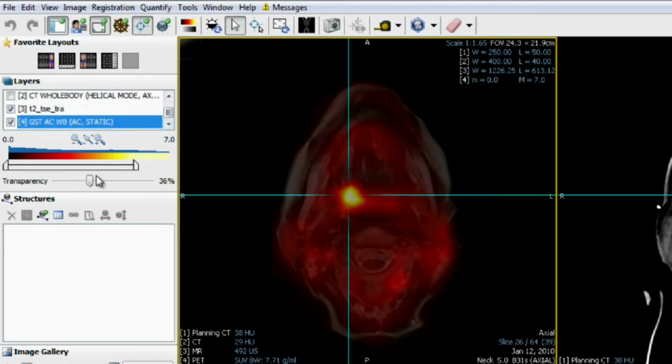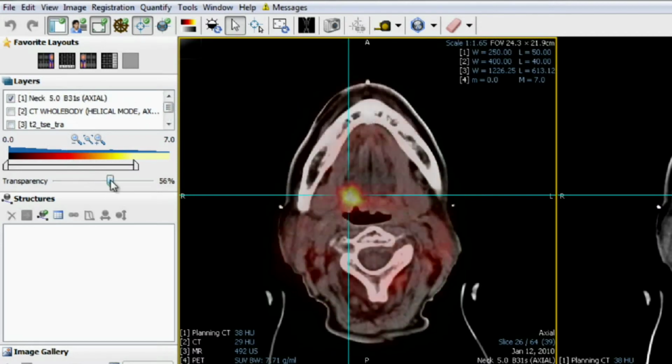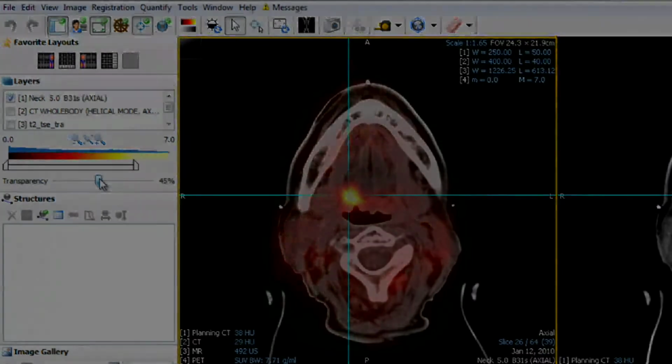Note as well that a layout can be configured to display all the datasets fused together, and that each can be disabled independently to present the fusion of the desired 2 or 3 datasets.